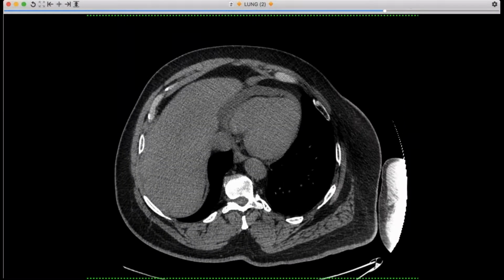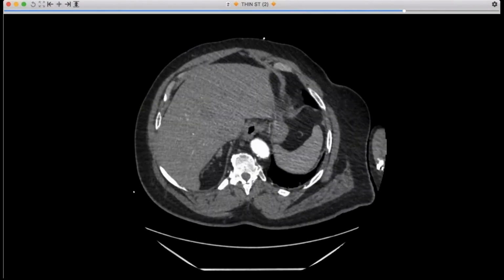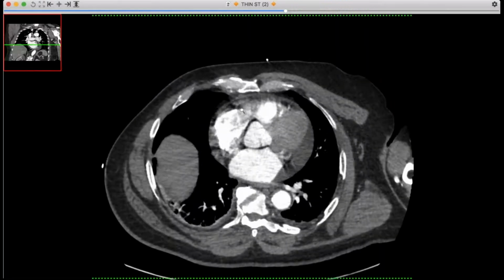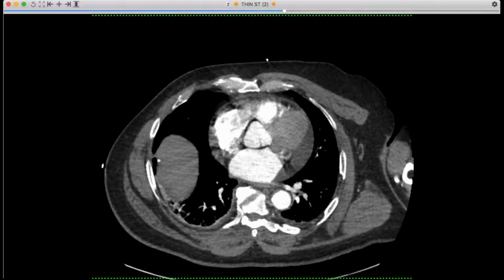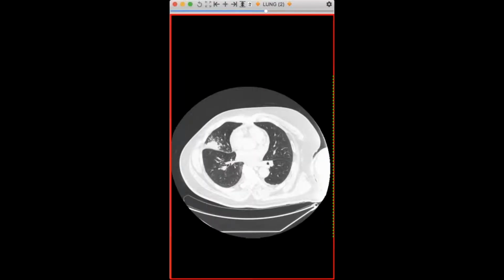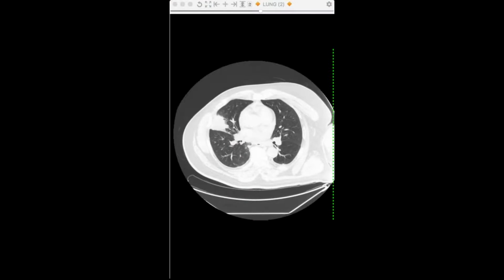And the pericardial effusion, if I remember, was not an acute thing. So he may have had pericarditis at the time, and maybe some left heart disease, and had some pleural effusion as well. But I'm really interested in this lung because I have never seen this presentation of this pathology.